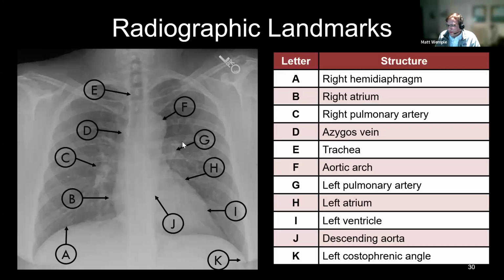And why do I know that that's a right middle lobe pneumonia? This is where these radiographic landmarks are helpful. The right middle lobe sits anteriorly, and that's also where the right heart border sits anteriorly. The right lower lobe is more posterior and sits right above the diaphragm. So anytime this right hemidiaphragm is lost, something is going on in the right lower lobe.